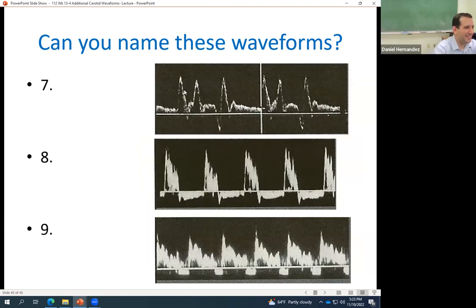What's this one? That's the balloon pump, right? Aortic balloon pump, yep, second heartbeat. Good. And then water hammer. Yeah, this is with aortic insufficiency, severe AI. And this is crappy, but it's supposed to be your bidirectional pseudoaneurysm. I know, it's really bad in this one, but this is supposed to be bidirectional, like forward and then backwards, the neck of a pseudoaneurysm.